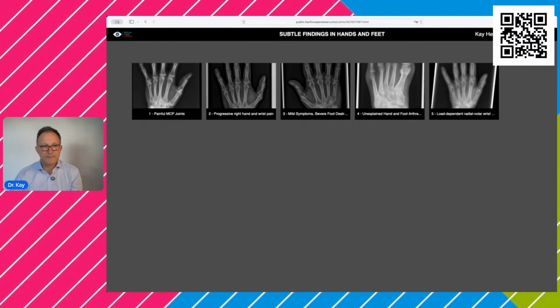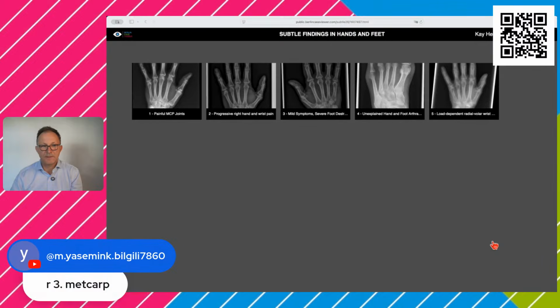Any comments? Third MC, Yasmin, you have done it right. Third metacarpal, very good.